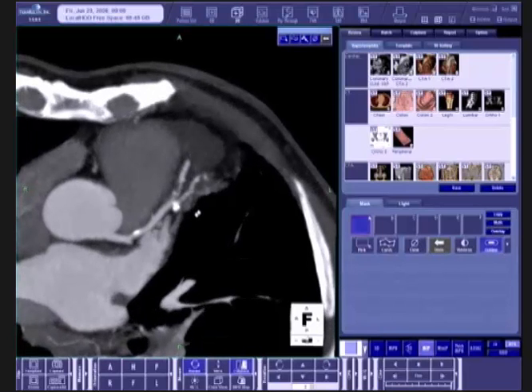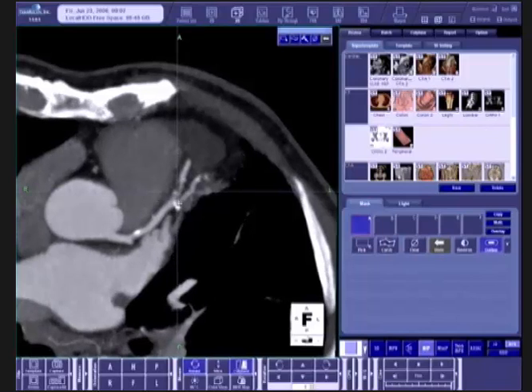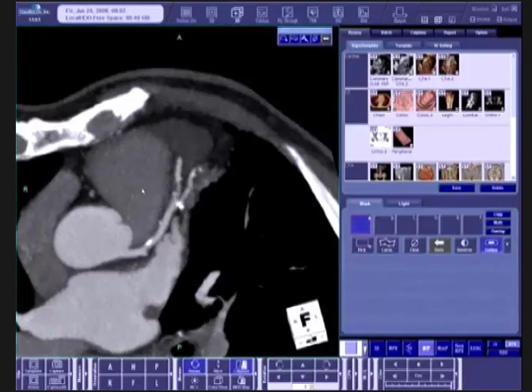Sometimes that brings out features that can be a bit better understood. Or more commonly, what I will do is arrange this to be either again in a vertical or horizontal fashion, and then I wish to rotate about this axis.